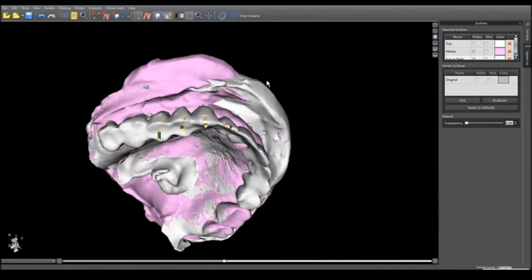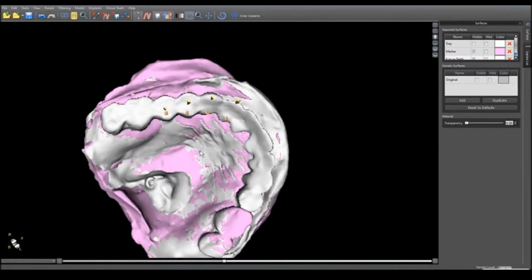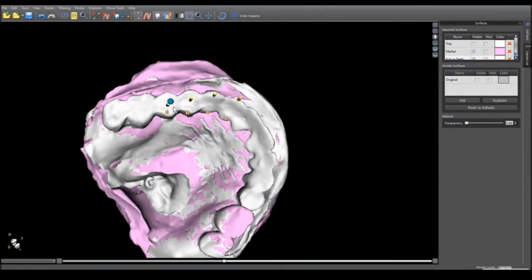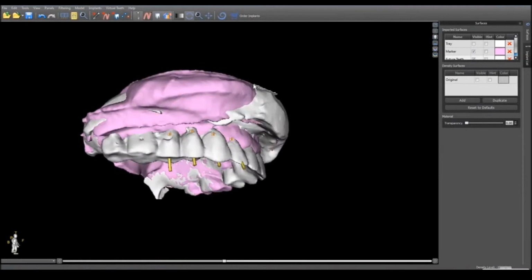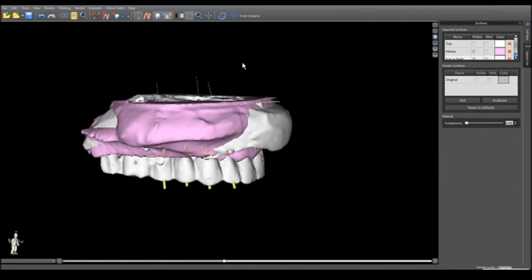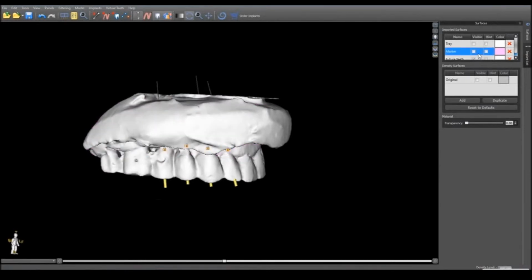So that was in the mesial distal dimension. And then buccal lingual, I'm able to see exactly where these are. The center line of the implants are in the center of each bicuspid, incisal edge, incisal edge. So that was the first phase of planning. I'm able to project the outlines of the temporary bridge onto the cross sections.